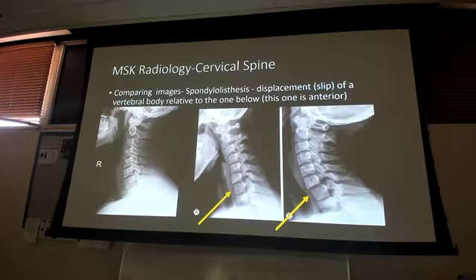And all of these guys above it are gonna follow. When this shifts, all of them shift with it because they're all connected. So we're gonna have more practice at this, but we name it for the two vertebrae that are involved, so C6, C7, the direction that the superior segment goes, so anterior spondylolisthesis.